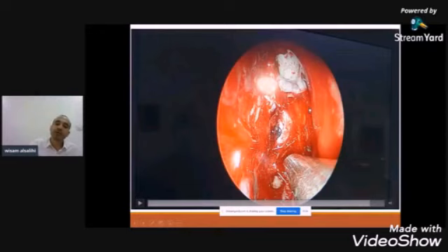I expect the course of the anterior ethmoidal artery from the lamina in this part between the frontal sinus and this defect, from the lamina papyracea to the septum.